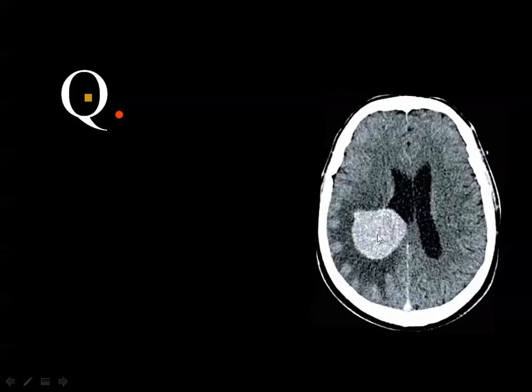And the meningioma will show most of the criteria of meningioma, like homogeneous enhancement, a smooth margin, and may contain calcium. This edema around the tumor is due to trapping of the occipital horn. The meningioma will occlude the CSF flow from the occipital horn, and it will diffuse around the ventricle.